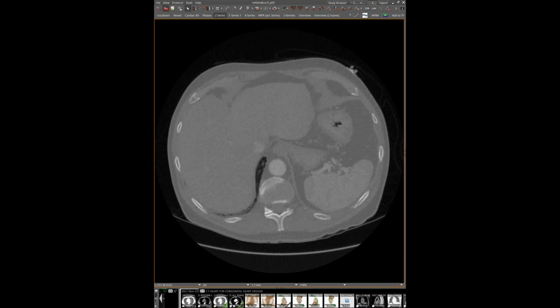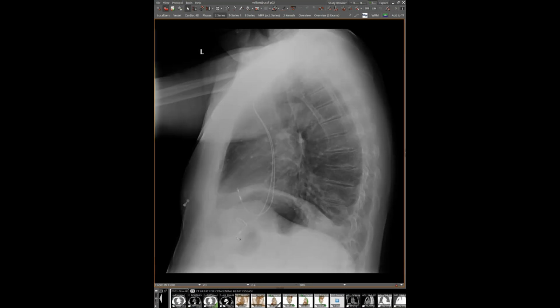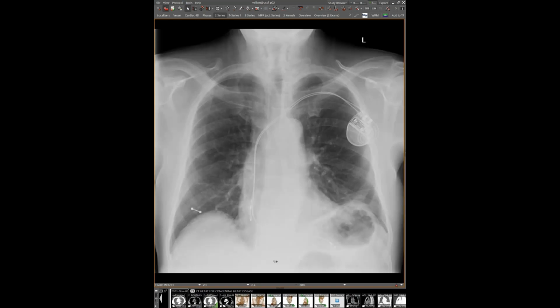Because I mean, it looks like it was positioned part of the way when they started. Yeah, and realistically, this CT was done one day after this X-ray. So it makes me wonder whether it was already down there touching the stomach on the X-ray, but I don't know. Yeah, that may be true. This X-ray didn't strike me as being that abnormal. But yeah, that's puzzling that it went through so much tissue to get to the ultimate location. That is startling.